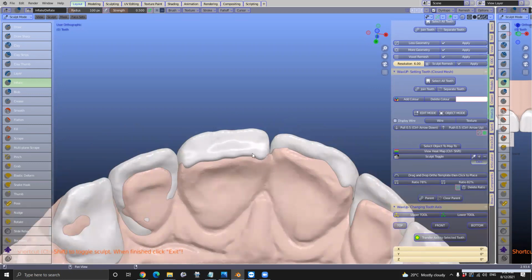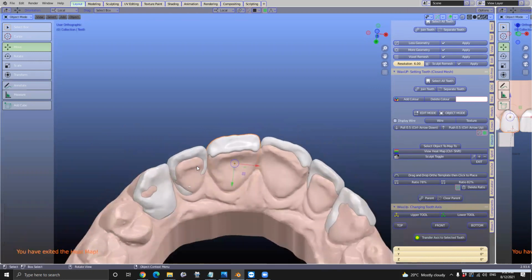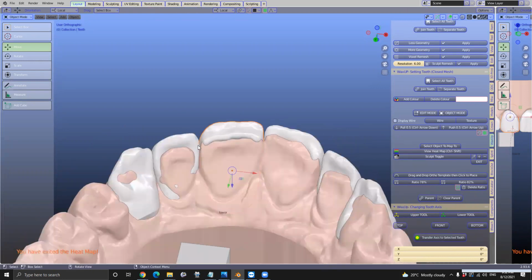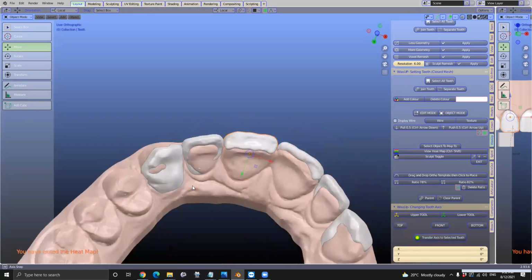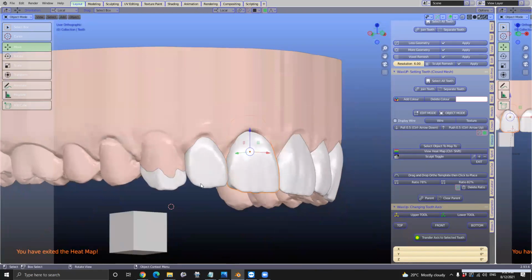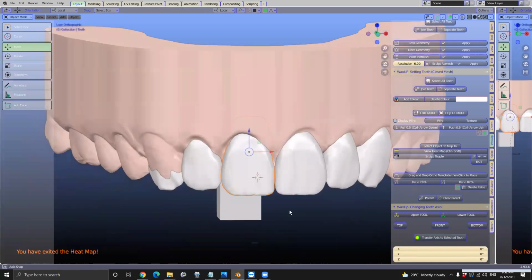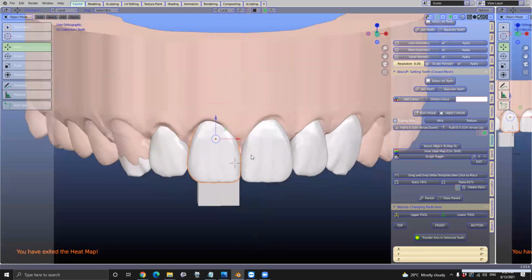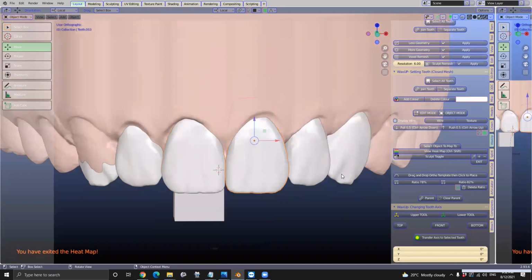What about surface topography if you wanted to add a little bit? What surface sculpting tools would you use? Would you use the crease tool maybe? Oh, like very fine lines and stuff. Yeah, Wolfgang, is that what you're talking about? Yeah. Okay, so you're talking about remodeling the teeth.